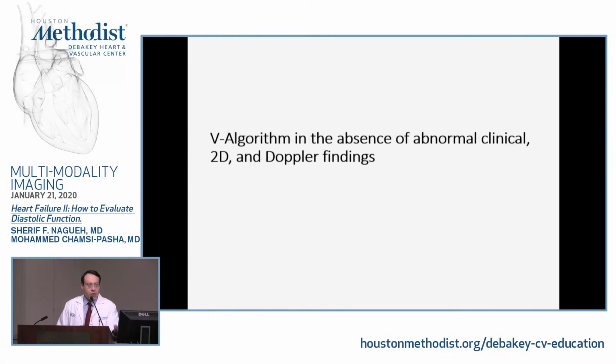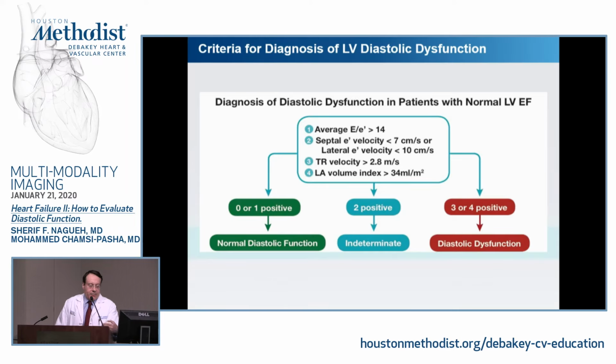So now if we've seen the whole study and everything looks normal, these signals are not there for us or they are normal, what do we do? Before jumping and saying someone has diastolic dysfunction, we want to look at several variables: annular velocities, E to E prime ratio, average septal and lateral, peak TR velocity, which we should acquire from multiple windows, and biplane LA volume. Important to record correct LA volumes, which means we may foreshorten the left ventricle by going one higher intercostal space to get the correct LA volume instead of the same view that gives us the maximum LV size.